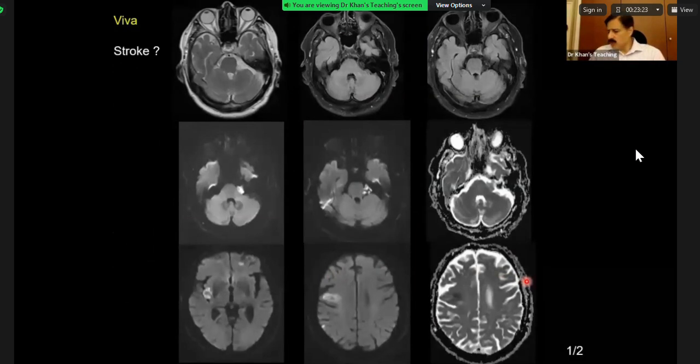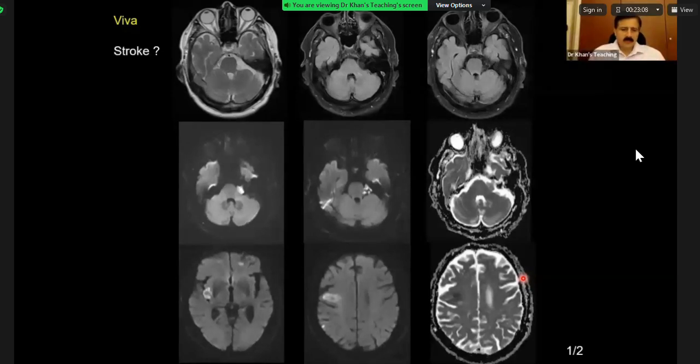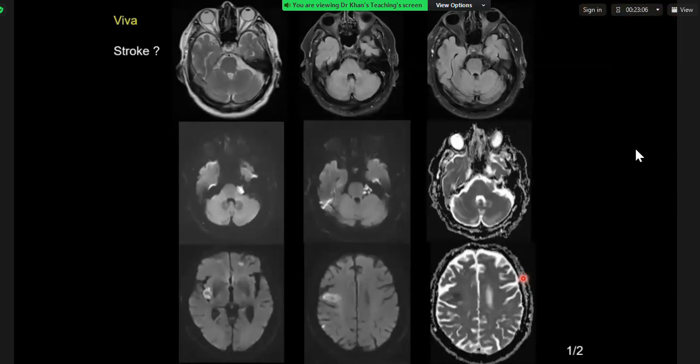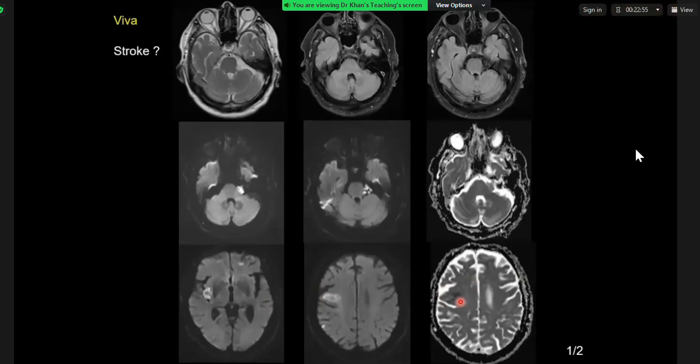The last two, three or four cases, just for pattern recognition, and then we'll stop. Yes, please. Okay, on the... Is there an acute infarction? There is restriction diffusion. So clinically, we were worried about infarction, so there is restricted diffusion, right? Yes. What else is happening?